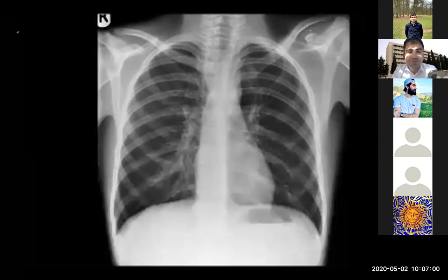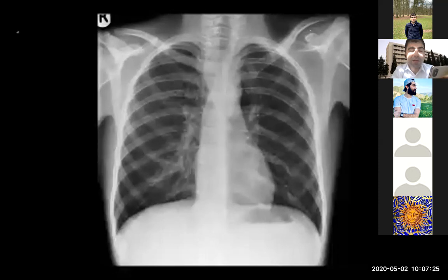And actually, we have this chest X-ray. If you concentrate on that ABCDEF system, you may not see any lesion, but don't forget to check the cervical ribs, especially if you write down some of the notes that the patient has a problem in his arm, left hand, for example, while he's walking. So there is some vascular compromise on the left side.